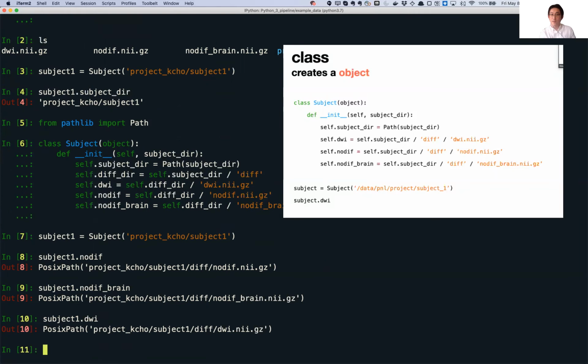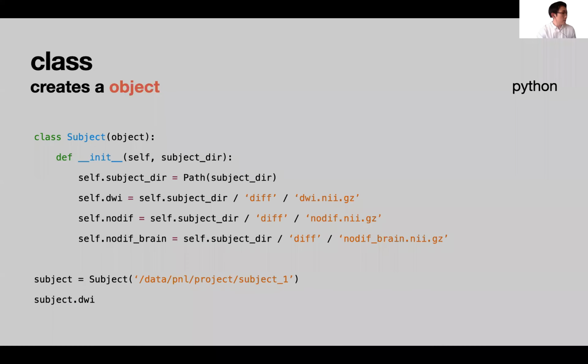Yeah, everything is registered. This might be confusing in the beginning, but if you keep every variable related to the subject that we're going to analyze, it is much simpler later. So if you forgot where the mask is, or at the end of the day, you don't even have to remember where your mask is. You just have to set it once and then keep the rule. Okay? All right.